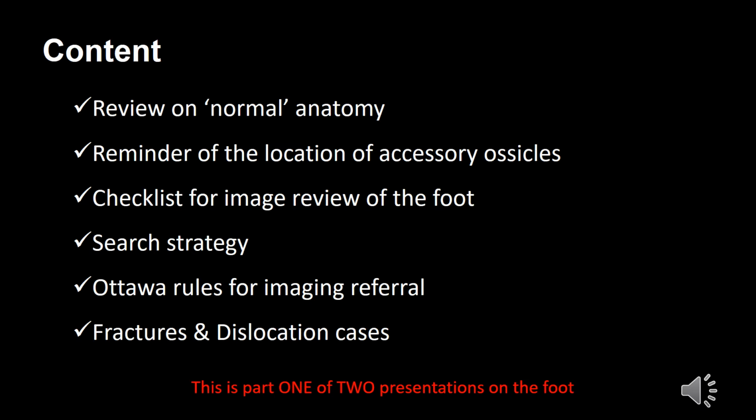Welcome to part one of this presentation about the foot. So in this presentation we will review firstly the normal anatomy and remind ourselves about the location of normal accessory ossicles. We will devise a checklist for image review of the foot to make sure that you cover all aspects in making your diagnosis. We will look at a search strategy.